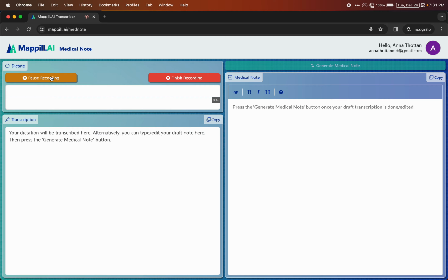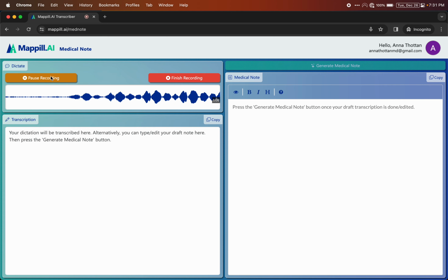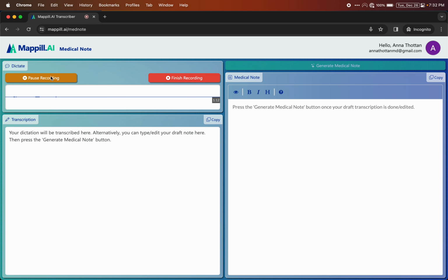Next line, past medical history significant for rosacea and cholecystectomy. Next line, family history significant for hypothyroidism in her mother. Next line, social history, no smoking, no alcohol use, no recreational drug use. Next line, labs. As of 11/29/2023, TSH noted to be 18, free T4 at 0.24. Antibodies are not checked.